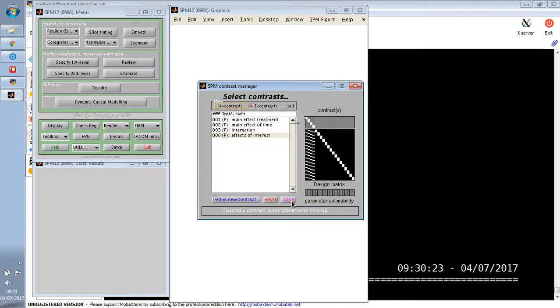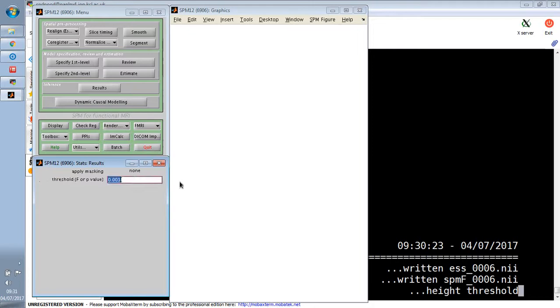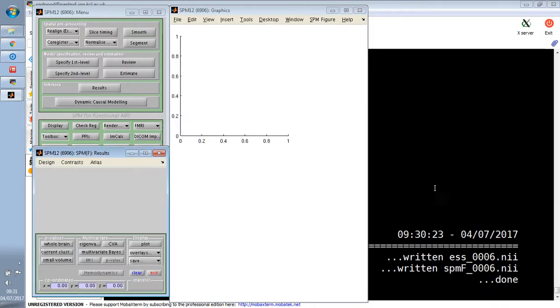And again, I'm going to show you the value of this contrast. Give it a couple of seconds to produce the image. Again, it's a very liberal contrast. We're asking if any of those individual columns is non-zero, up or down, so it'll give us pretty much all the brain. But what I'll show you then is how you can use that to understand what's driving the effects you're seeing in the interactions or in anything else.